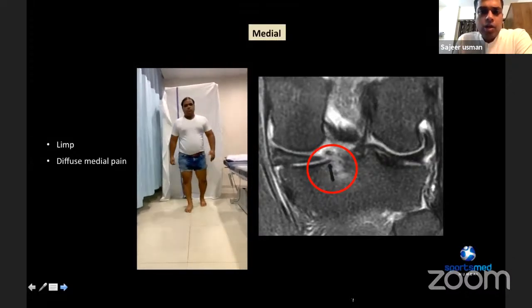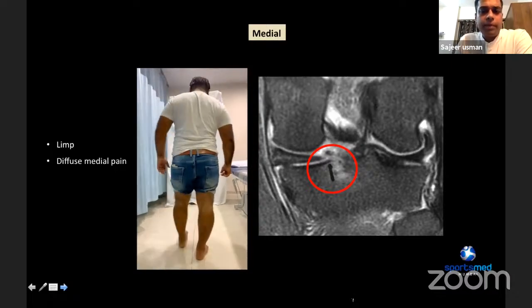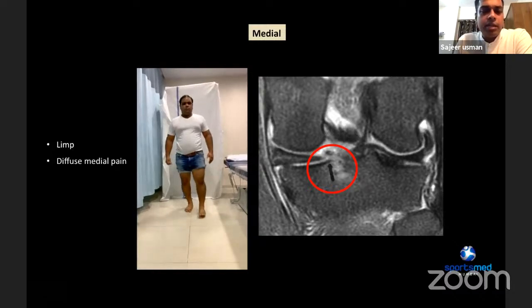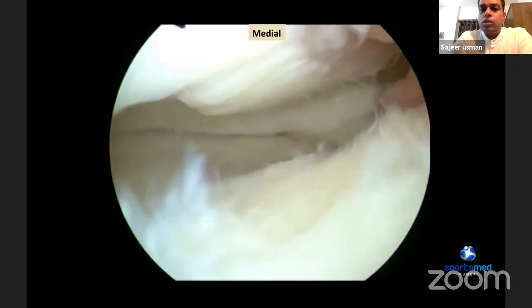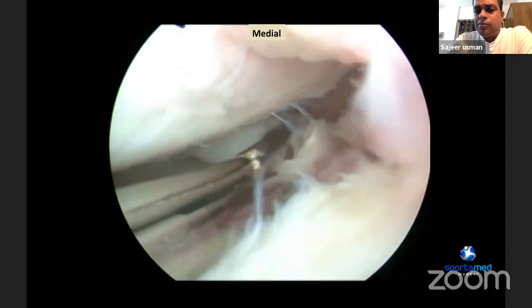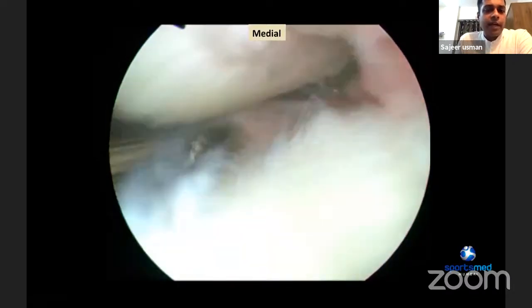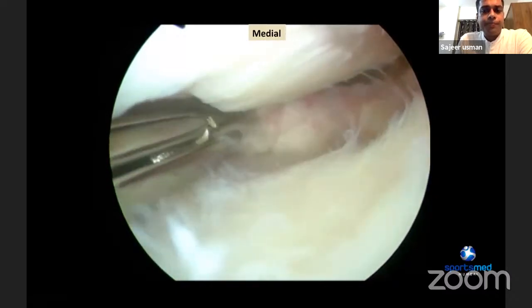And this is the cause for the present symptoms, because sometimes in degenerative knees, we find root tears reported, but they're not acute, they're chronic in nature and less likely to be repairable. Most often we are jinxed in surgery when we go ahead for a root repair. We find extensive cartilage degeneration, frayed and degenerative medial meniscus tissue. So we are often wondering whether we can have some MRI findings to predict whether this was repairable in the first place or not.